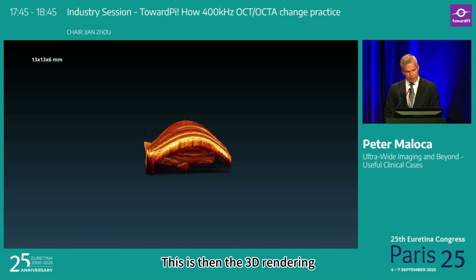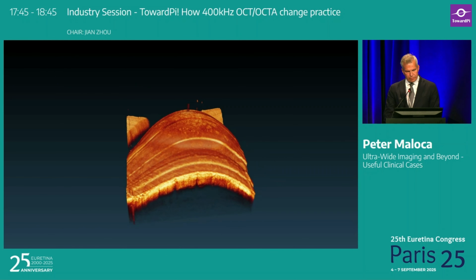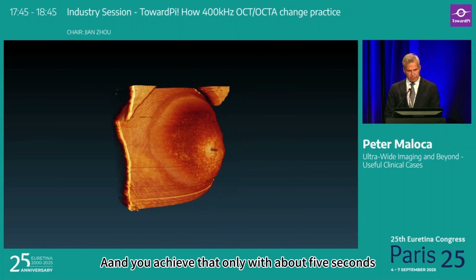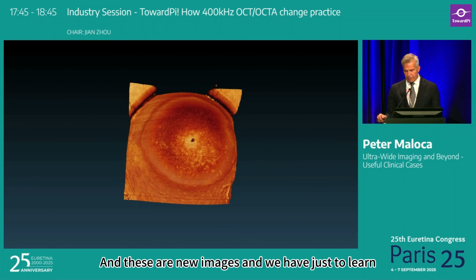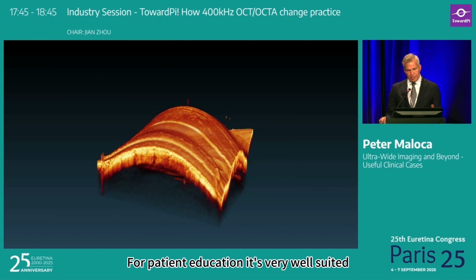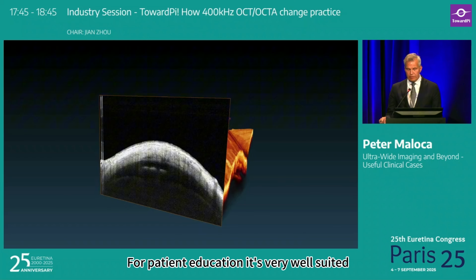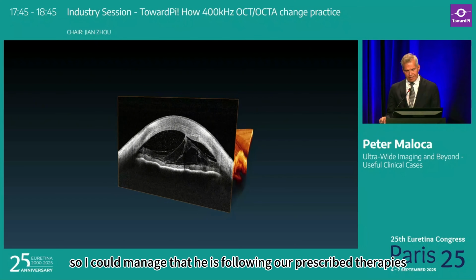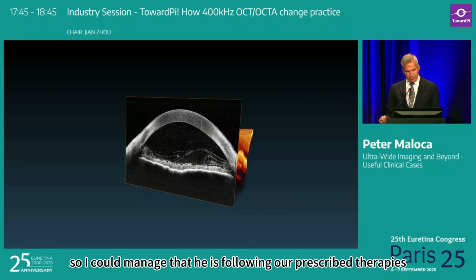This is then the 3D rendering. And you achieve that only with about 5 seconds. And these are new images, and we have just to learn how they look like. For patient education, it's very well suited. So I could manage that he is following our prescribed therapies.